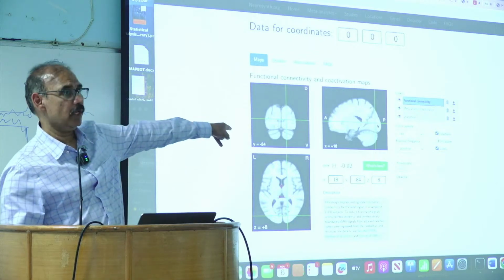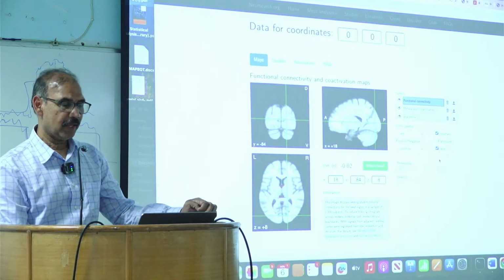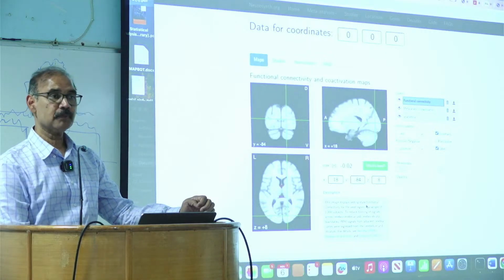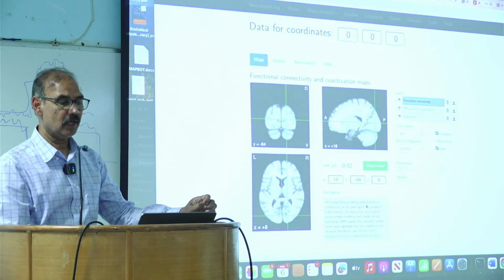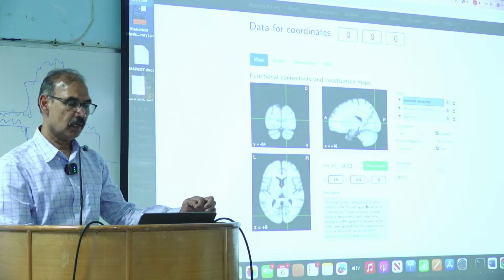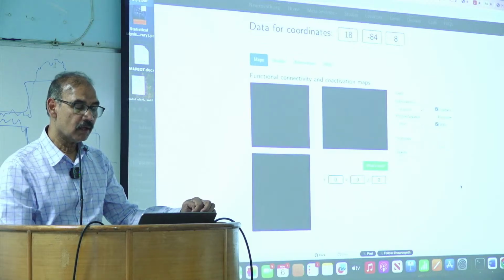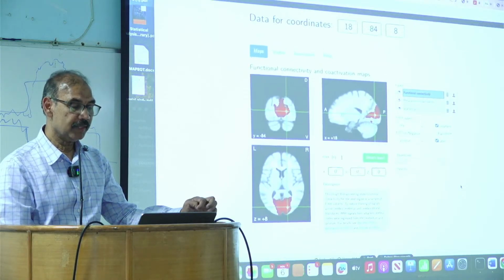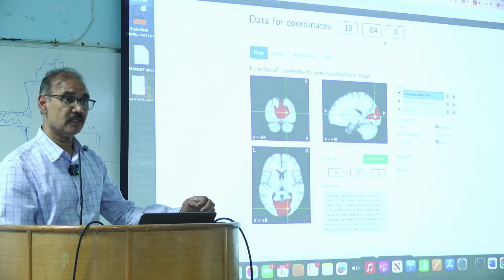Just see on the location. Is that the visual cortex? Okay, so then the coordinate is 18, minus 84, and 8. Those of you who have done, maybe try this coordinate and see what you get. Is this an MNI? Yeah, so try this location and see what you get.